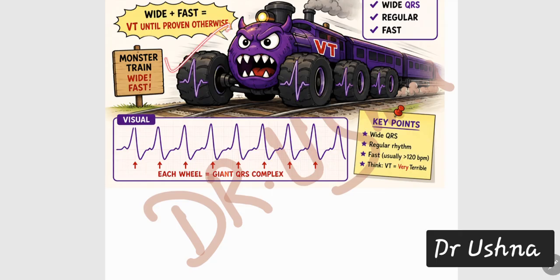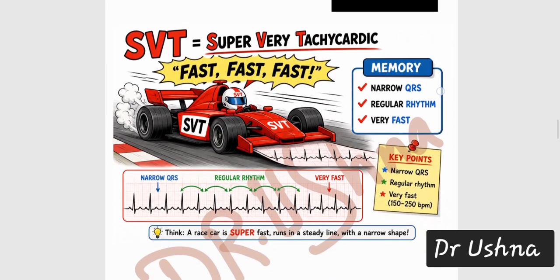This is your VT, and this is an emergency. Okay, a VT patient can deteriorate anytime. This is your emergency condition. Next important thing is SVT.